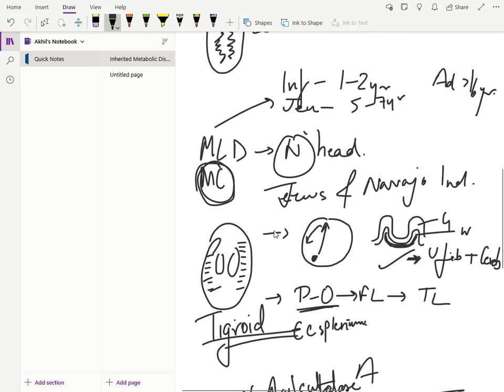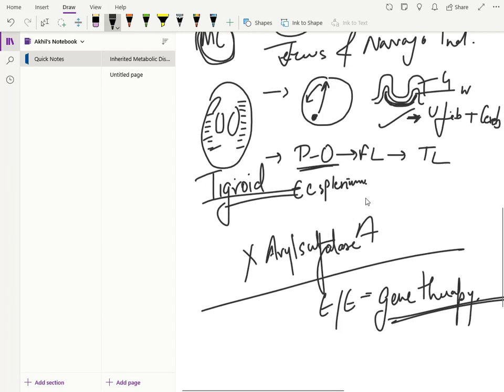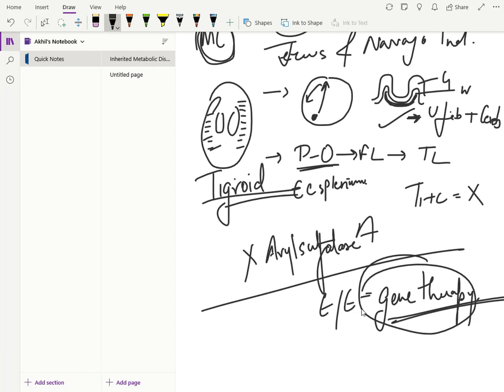There is very mild volume loss, hence you have the normal head, because there is very low volume loss due to the disease. And on contrast, you have no enhancement. On T1 post contrast, there is no enhancement. So that's all the imaging points. And usually people who can't afford the gene therapy usually die within 4 years of the disease.